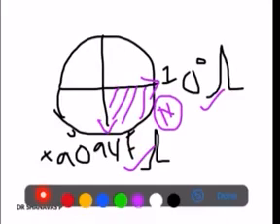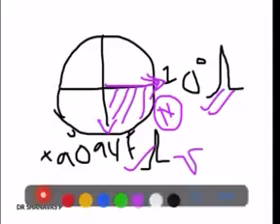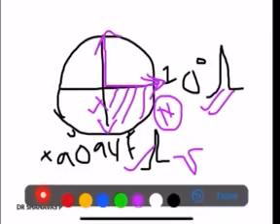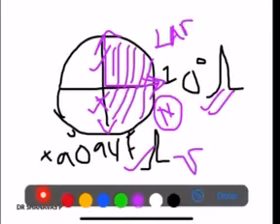Assume in another ECG lead 1 is the same as before, but lead aVF has a QRS in the opposite direction. That means the direction of the vector has changed to here. Now the aVF is this. So where will the axis lie? The axis will lie here. We know that this is the position of left axis deviation.